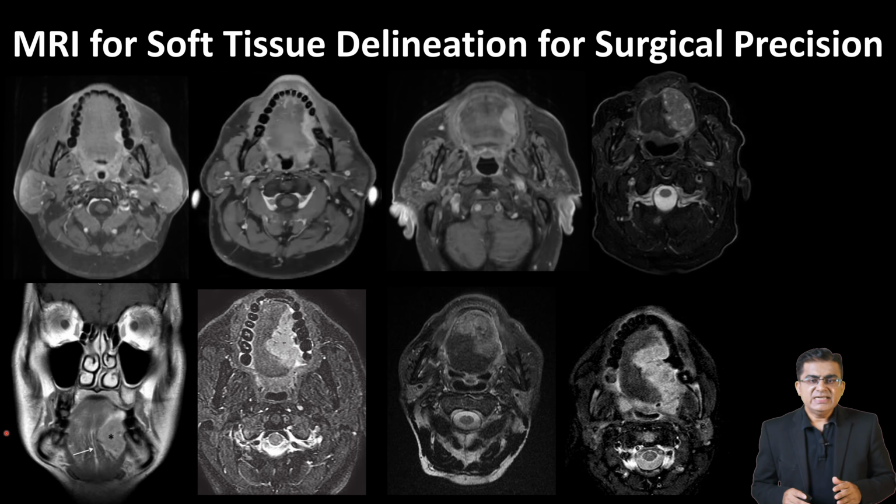Now all these detailed information about the lesion will impact your surgical plan also. What type of surgical excision will all these 8 patients require? Let us break it down. Patient 1, top left. There is a small superficial lesion confined to the extreme left lateral border. The depth of invasion is minimal. He will likely just require a wide local excision or partial glossectomy.